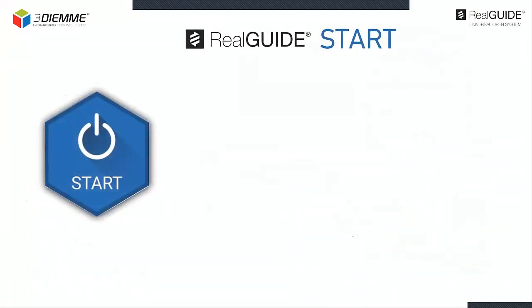Real Guide is made up of several licenses with different features. Let's quickly see the possible solution for each single module.